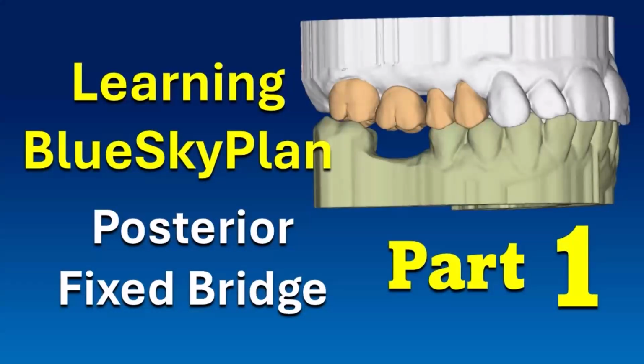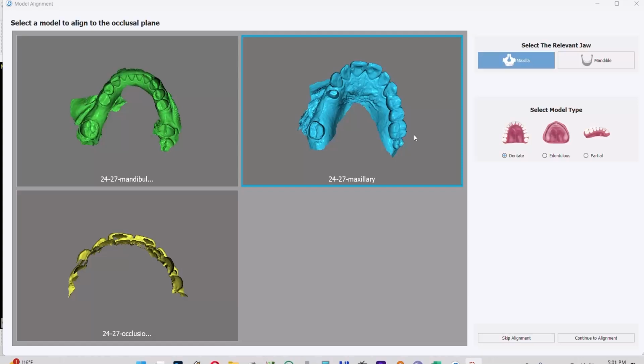In the coming two videos, we'll learn how to prepare a posterior bridge for the maxillary arch. Here you could see we have a prepared maxillary second molar and a maxillary first premolar, and we'll be designing the bridge between them. In order to do proper occlusal orientation, we can't do it on this cast because it has a posterior prepared tooth, while on the other side it's not prepared.